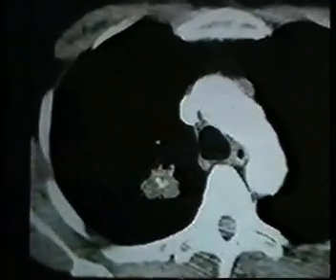These are 1 centimeter collimated scans in a patient with a rather irregular-looking nodule in the upper portion of the right lung. On this scan, we see several areas of calcification. At a higher level, we see another large area of calcification. Unfortunately, neither of these is clearly central in location. This actually was on the edge of the nodule, and even though it appears central on the CT scan, it is not indeed central within the nodule. In the absence of definite central calcification, you better be wary about calling a nodule benign. Also, with a nodule of this rather large, irregular shape, you better be wary about calling it benign, because certainly carcinomas can have calcification like this, and this was an adenocarcinoma.